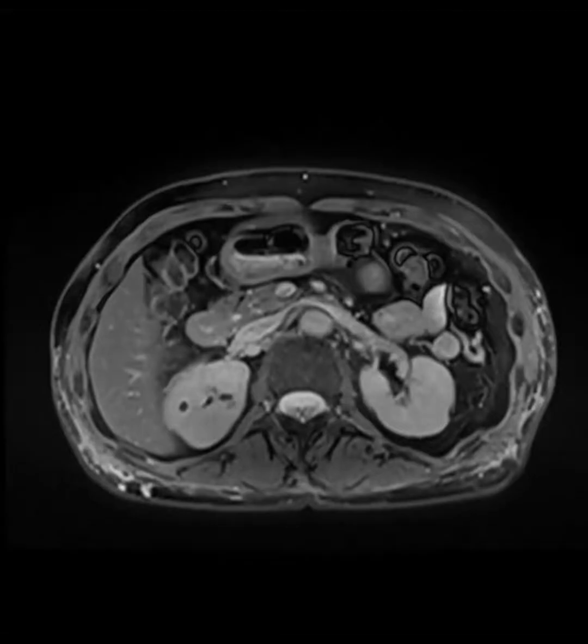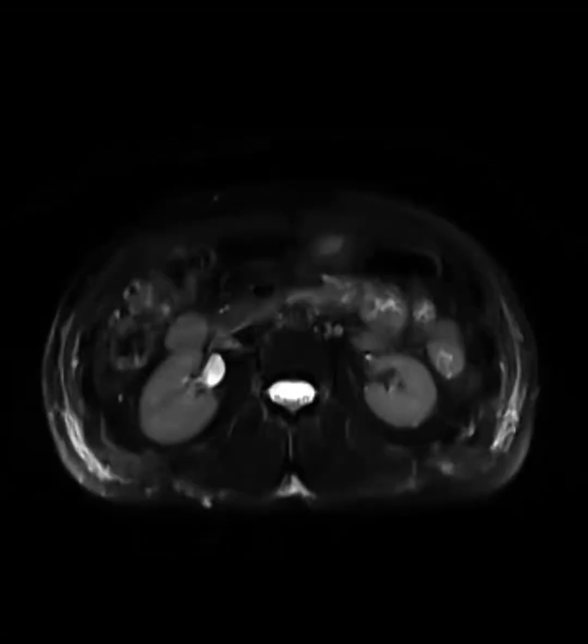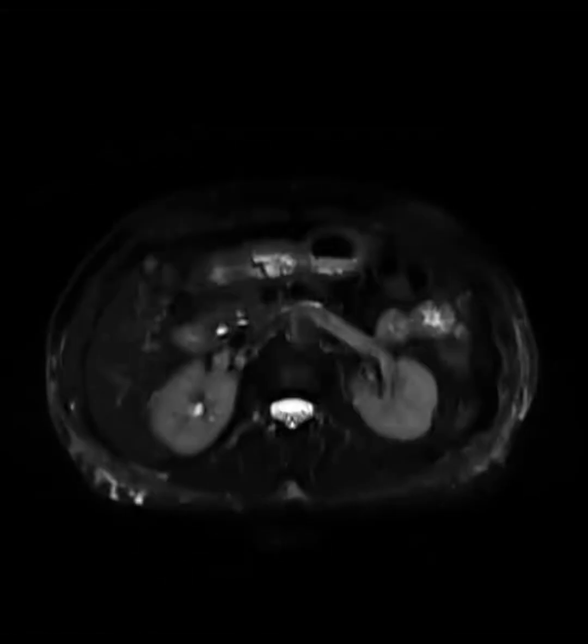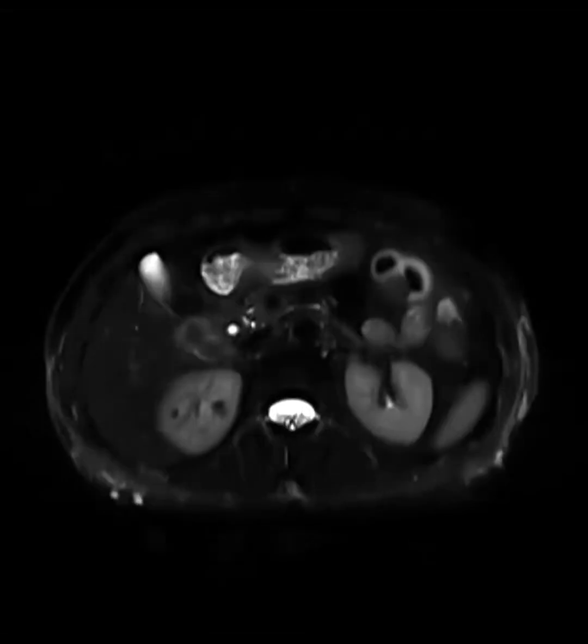It's interesting. There's not a lot of enhancement, whereas we think of AMLs as angiomyolipomas with a lot of enhancement and washout. Maybe this is mostly lipo. Yeah, this is a really fatty AML. So it's not a lot of muscle, and that's why it's so T2 bright and not really enhancing. And here's the T2 fat-sat. And then on the out of phase, it had just the full ring of India ink artifact, so full fat that we confirm here. Cool.